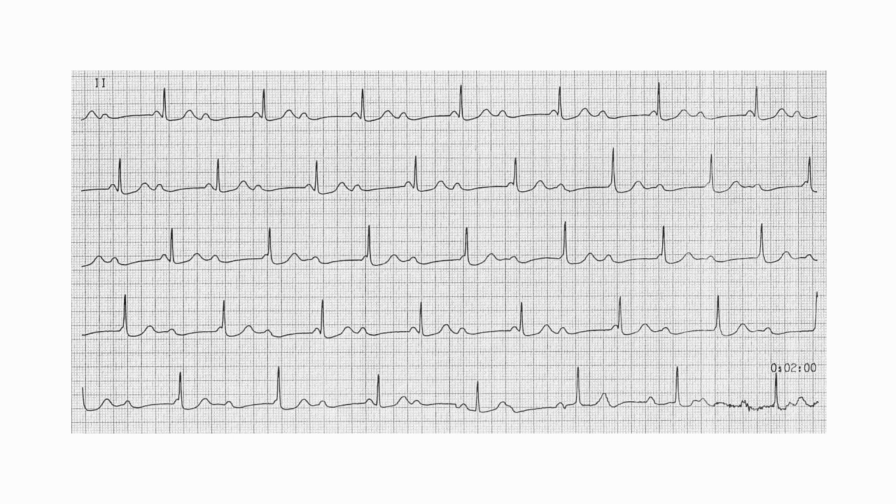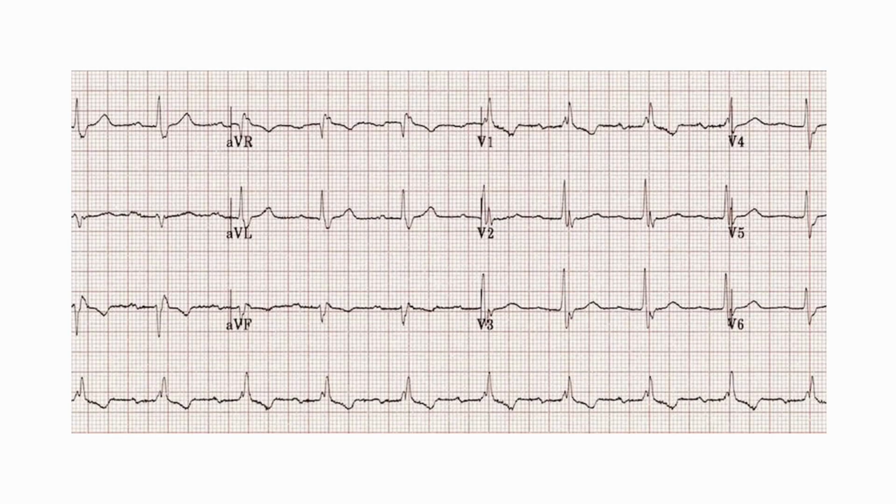This patient has come with a syncopal event and you notice that the heart rate is pretty slow. So this is a classical complete heart block. The initial treatment is atropine, atropine, atropine. However, most of the time it doesn't work. While we are waiting for a proper pacemaker, we can do transcutaneous pacing. And if there is an infectious etiology related to complete heart block, think of Borrelia burgdorferi, Lyme disease.